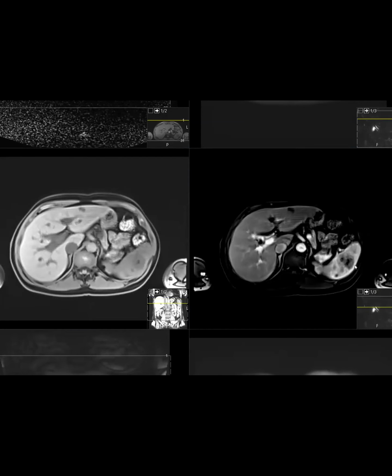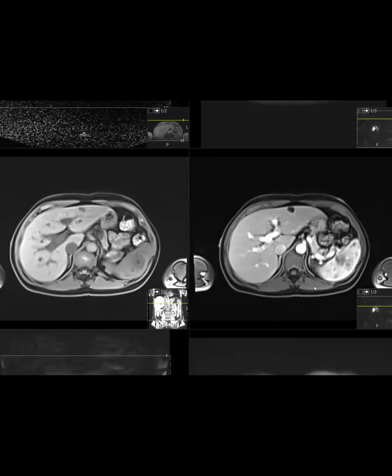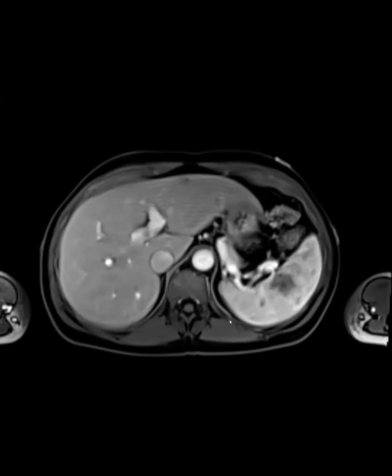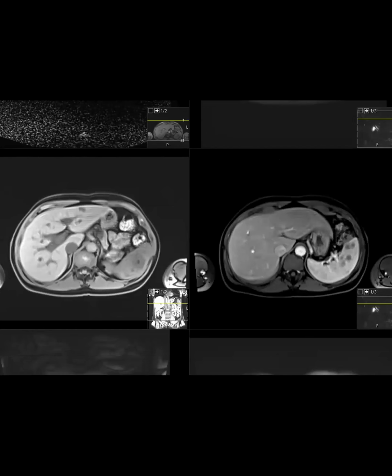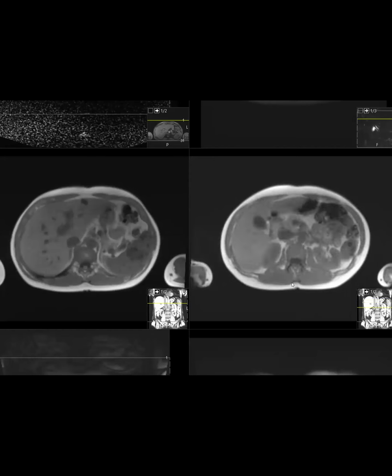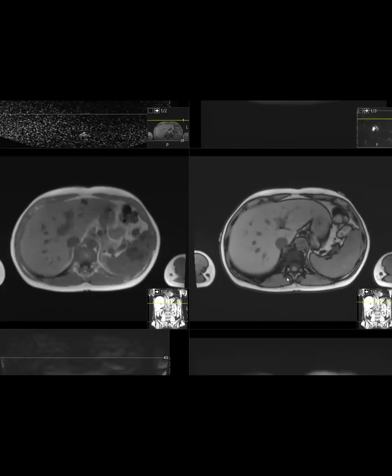So they're a little bit dark. And then this is the venous. And I'll tell you, they just kind of had some progressive enhancement. So what do you guys think? You said they were dropping on the in phase. I'll bring that back up. Right, like some bunch of hemangiomas or something in the spleen.